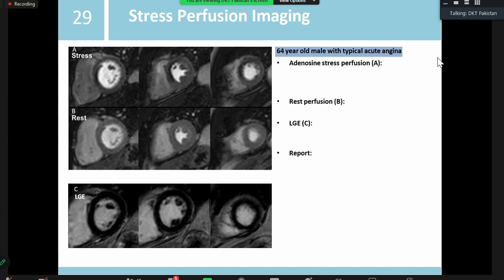Okay, good. Excellent description. I really liked your approach, although you didn't speak about the right terminology, but it's okay. Your concept was good. You talked about the right things. You picked up the findings and described it well. No matter if your terminologies are incorrect, you need to describe the concept well. If the examiner tells you to use a particular terminology, then you have to change to that terminology. Otherwise, if your concept is right, the examiner may or may not intervene in between.